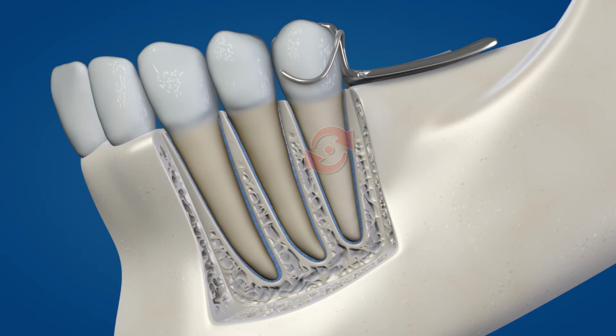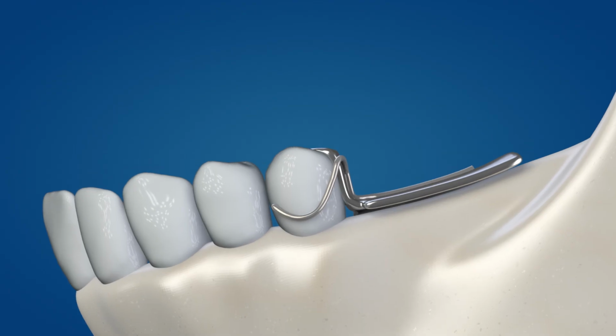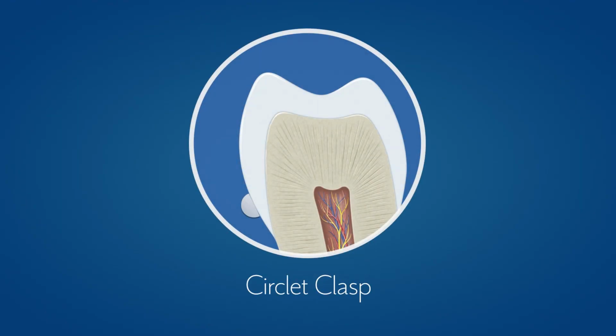One may suspect an accompanying rocking or torquing of the abutment with a strong potential for periodontal destruction and tooth loss. But there is a distinct structural difference between a traditional circlet clasp and a combination clasp which warrants consideration. To clarify this structural difference, we will start with an examination of the circlet clasp, and specifically with the cross-sectional geometry of the retentive arm. Here, we have a cross-sectional view of the conventional circlet clasp on the facial surface of an abutment. Please note the D, or semicircular profile.